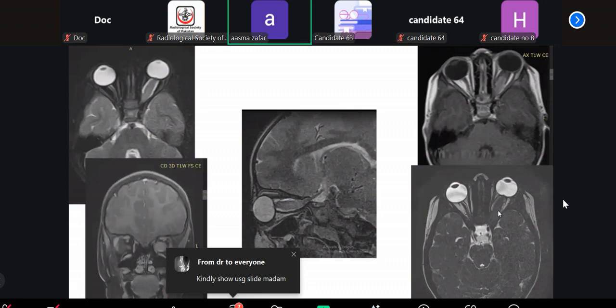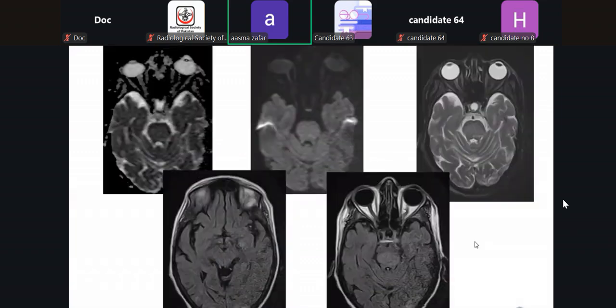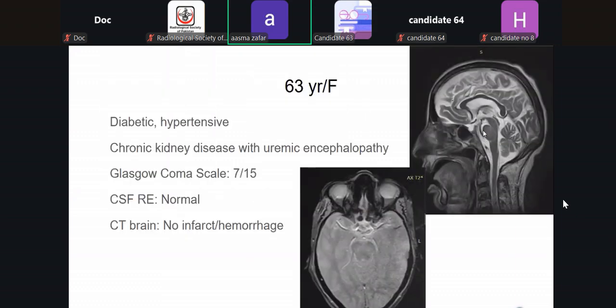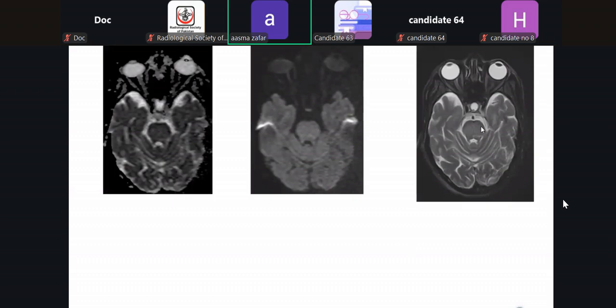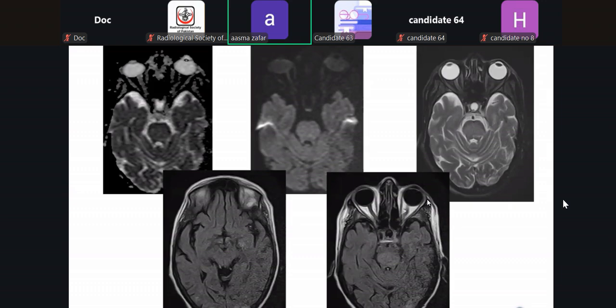Okay, if this comes up ahead, we will discuss it there with the next candidate. So this was PRES, you diagnosed it right, but this is midbrain. This is midbrain, I showed you here too: midbrain hyperintensity. And what is this image? Axial T2 star GRE. This is to look for blood. Yes. This was just to show that this hyperintensity did not contain any blood.